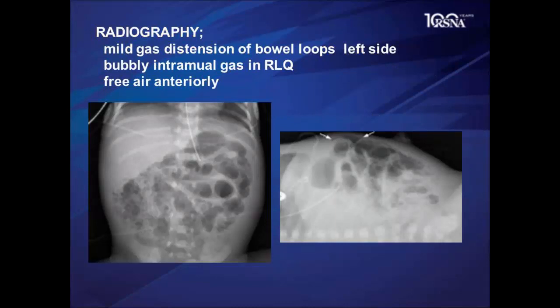Let's see examples of it. Here, abdomen, but one would be worried about this bubbly gas here. Pneumatosis. Cross-table lateral view is elegantly showing the triangular shape. Air has escaped. This is perforation. One will not recognize it here as easily. So the value of cross-table view is here.